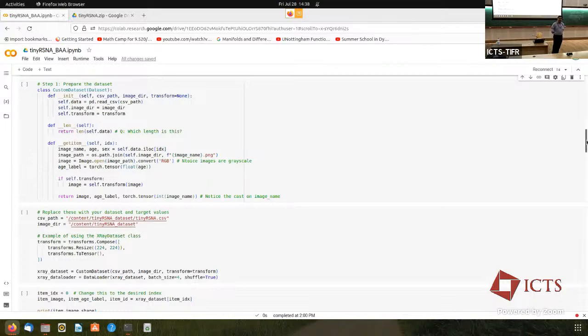So that's one of the exercises. You can think of how you would pad your images and then resize so that the aspect ratio isn't changed. You just get a black border. Okay? So I'm not going to do that right now. If the aspect ratio is distorted, I'm going to let it slide for this basic code. I want to make sure that this code runs. Then I can add all of these embellishments.